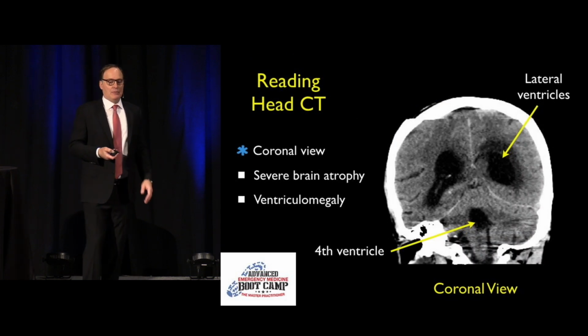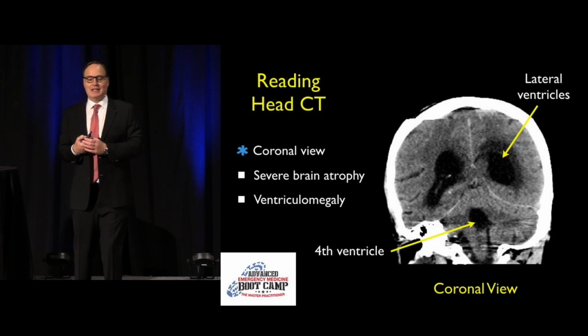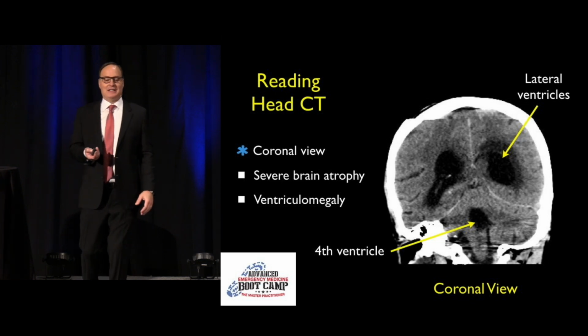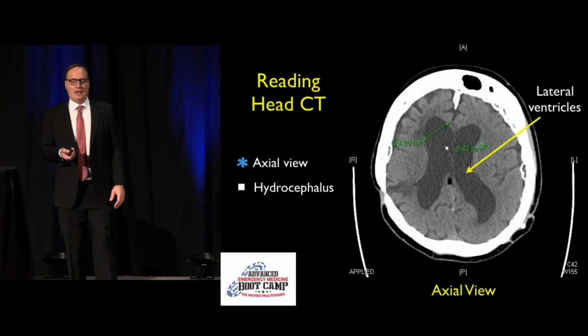Here's a patient with a lot more ventriculomegaly. I call it the crying eyes, and we can see this patient is not happy. The lateral ventricle is very large, and we can see a very large fourth ventricle crying out for help. So very severe ventriculomegaly in this patient.